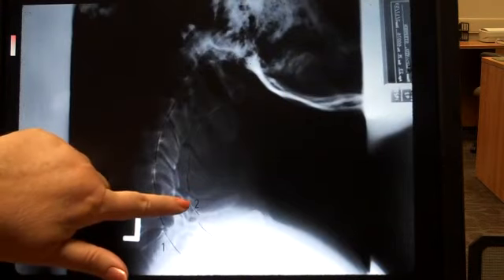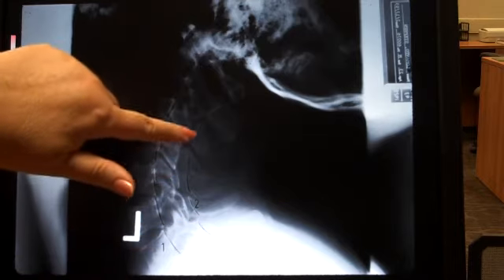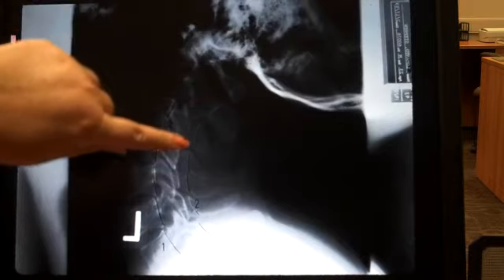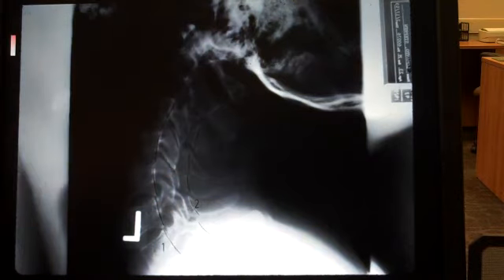Number two is posterior cervical line, looking at a line that is drawn along the spinolaminar junction line at every single level, including C1. And so we again are looking for a smooth, continuous line, and we have a little bit of an interruption again right there in that area. And so it is not as continuous as I would like for it to be.